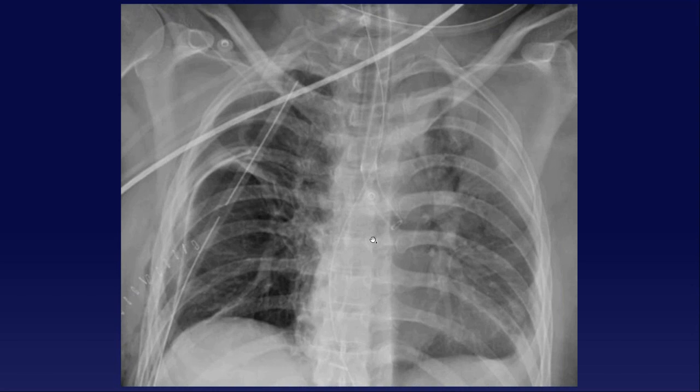Now this is a hard one. So when you see main stem intubations, it's usually on the right because the left main stem comes out more horizontal. I have never seen an accidental left main stem intubation. I guess technically it could happen, but I've never seen it. I don't even know if I've read about it. So this is a little unfair, but just be aware that sometimes for thoracic surgery, they'll do an intubation with a dual lumen ET tube so they can ventilate the lungs separately.